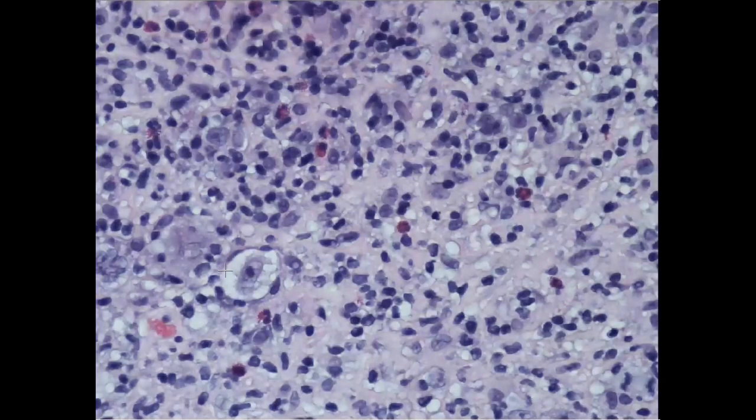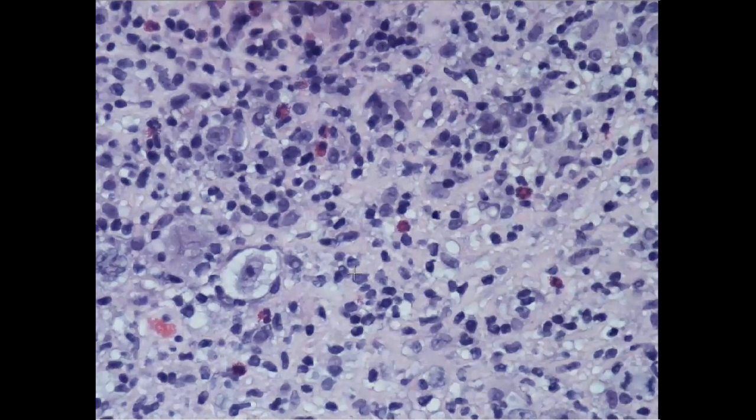So this one is a Reed-Sternberg cell showing this large size, showing this lacunar emptying or perinuclear clearing or halo. So this is a Reed-Sternberg cell. And from this power, you can see the eosinophils. They are much more here, and the interstitial fibrosis or these histiocytes in the background. So we diagnose this case as a classic Hodgkin lymphoma mixed cellularity type.